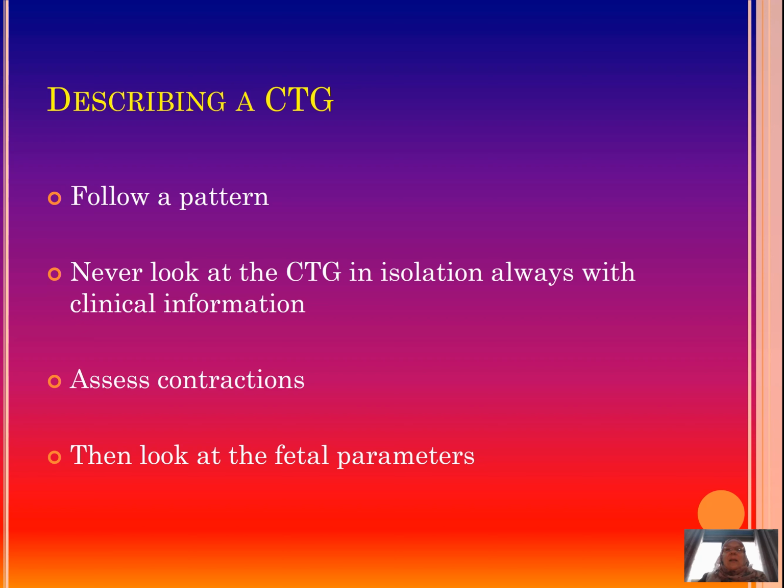So, is this an antenatal CTG or an intrapartum CTG? Is this patient low risk? Is she high risk? So that you know how to interpret a CTG appropriately and what actions to take in response to a CTG. You have to assess contractions, I've already said that, and after you've assessed the contractions, you then look at all the fetal parameters that we have just discussed, and we'll go through all of them one by one in the following of this presentation.